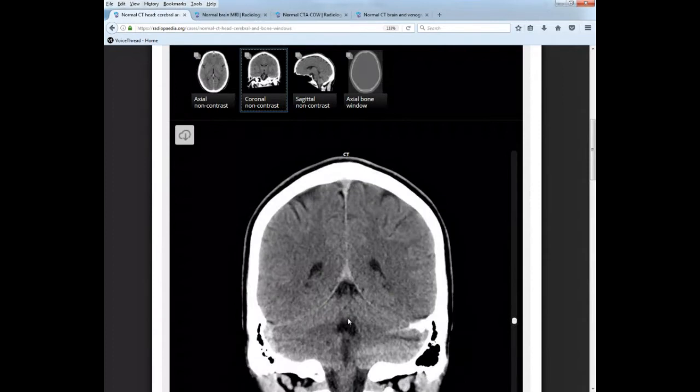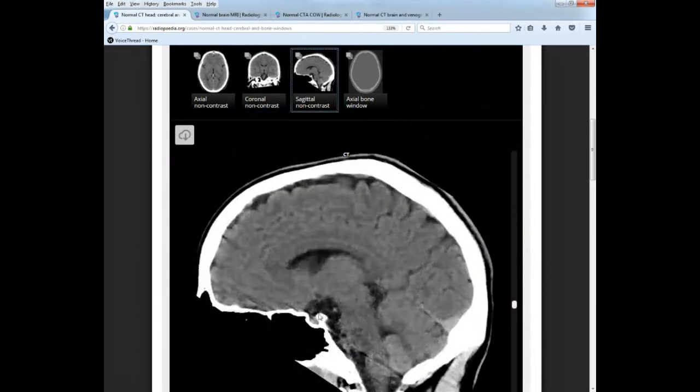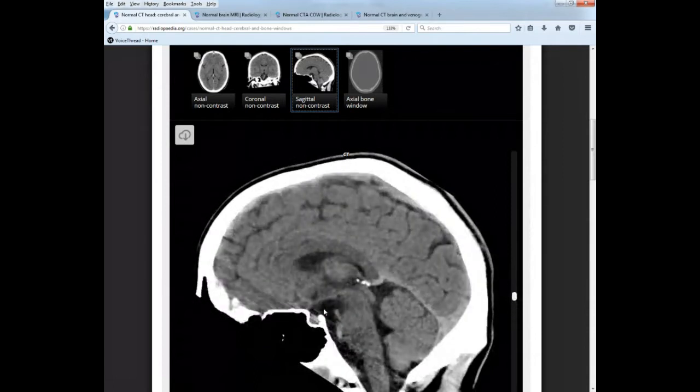Okay. Fourth ventricle, central canal. All right, so those are your ventricles. I did kind of touch on the cisterna magna right here. And then right here, your suprasellar cistern, the other cistern you need to do. On CT, super easy because you just look for sella turcica above suprasellar cistern right here.